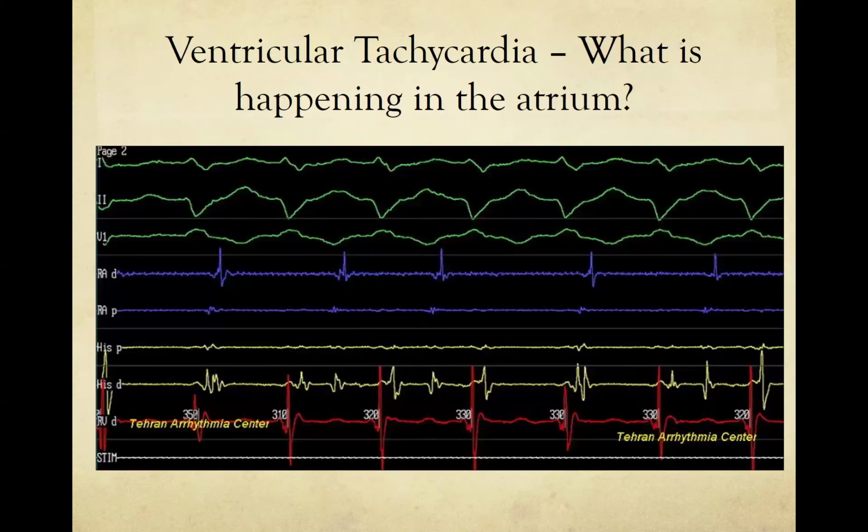Okay, so this is ventricular tachycardia. My question to you is, what do you think is going on in the atrium in this tracing? Let's just review the legend here. We have 3 ECG leads in this particular lab, which is the Tehran Arrhythmia Center. Dr. Magarefte was kind enough to give me this tracing. I'm just kidding. I found this on the internet about 20 years ago. We have 3 ECG channels, leads 1, 2, and V1.